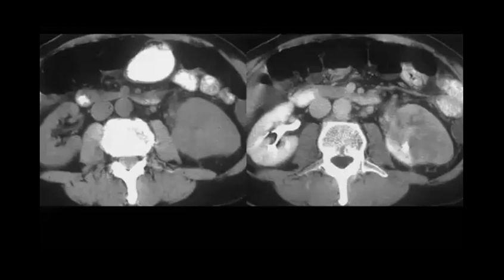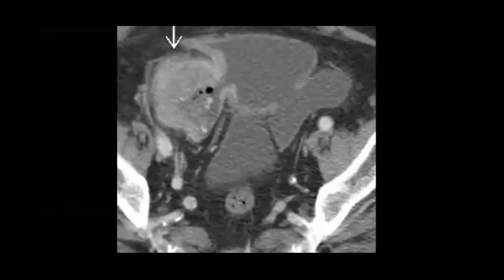Then I will show you maybe this one. So what happened here, how do you describe it? Yeah, Ala. Okay, you are so fast, mashallah. Okay, so we have a diverticulum and a soft tissue lesion.